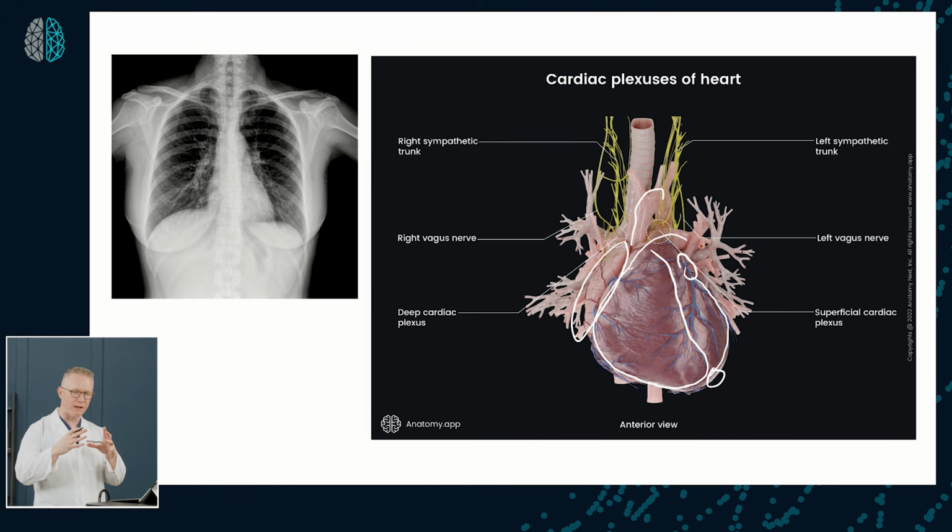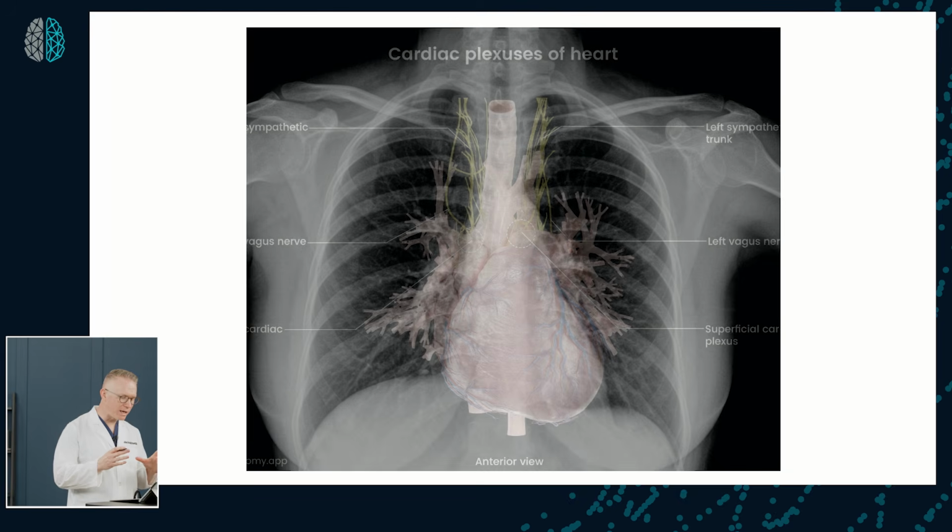So that becomes relevant if you start to see the borders shift and change, and you have a good quality image that is appropriately aligned with appropriate inspiration and visibility, right? Now let's take those images and let's now merge them together, okay? So here you can now see the image overlaid or integrated in what you should be visualizing in your mind.